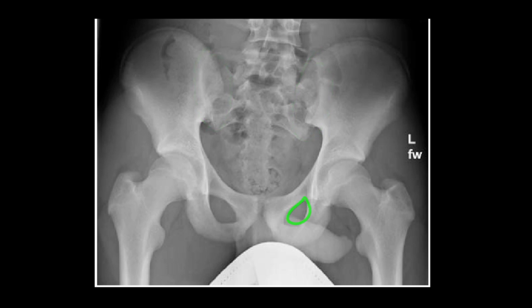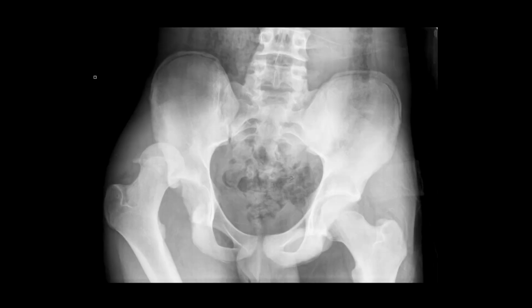And again, we would go on to trace the other rings and the other bony border and so on to make sure that we don't miss anything else, because you can indeed get multiple pathologies in the same x-ray. So the key with this is to be systematic and to always go through the full process. In the interest of time, we will move on. So here's our next x-ray. Again, if you can pause it now, and we will discuss it in a moment.